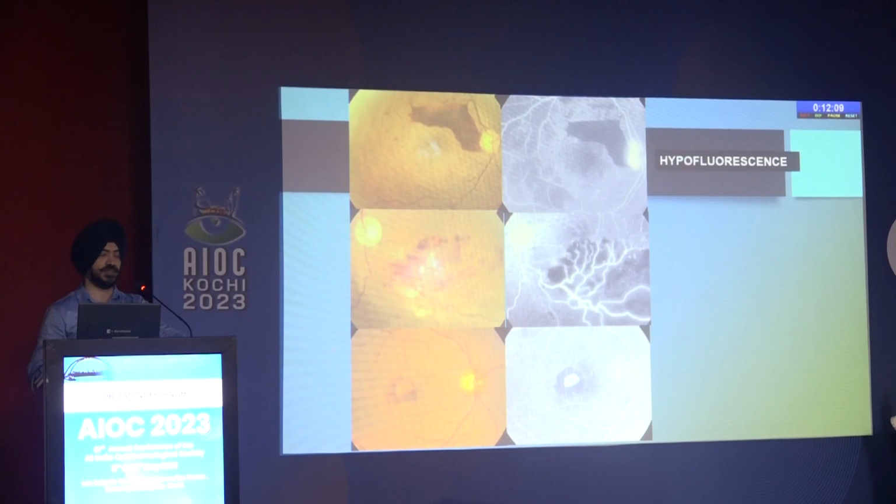In the first image, you see blocked retinal and choroidal fluorescence. In the second, you can see some ground glass appearance in the temporal part, but you can see some amount of blocked fluorescence as well. So the color of the hypofluorescence, how dark it is. If it is absolute jet black, it is probably because of blocked fluorescence. You might see some amount of ground glass haze because of some amount of choroidal fluorescence showing through. The last picture is of a CNVM. You can see the subretinal hemorrhage and the retinal vessels overlying it.